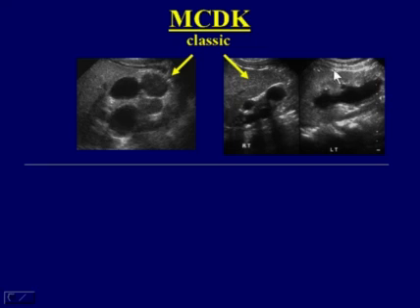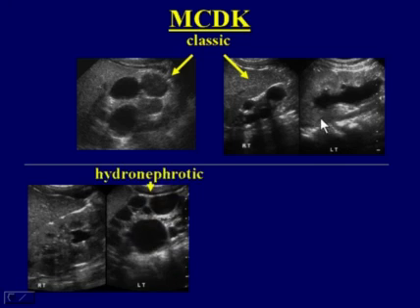Here's another one as well, but notice on the contralateral left kidney for this particular patient, this kidney is certainly robust and relatively large, but unlike the normal kidney that I'd shown you, there's no corticomedullary differentiation here. In fact, there may be small cysts within the parenchyma, indicating that this patient probably has some element of cystic dysplasia involving the contralateral kidney.